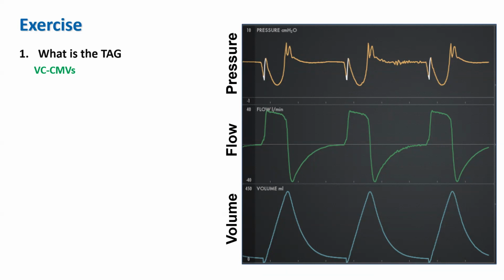The only way you're going to get a constant inspiratory flow is if you set it. So if you set flow and tidal volume, then you're going to get volume control. Also, every inspiratory time is the same length. So these are all mandatory breaths. And we don't see any compensation by the ventilator for the inspiratory effort, as indicated by the distortion of the pressure waveform. And so we're going to call that set point targeting.